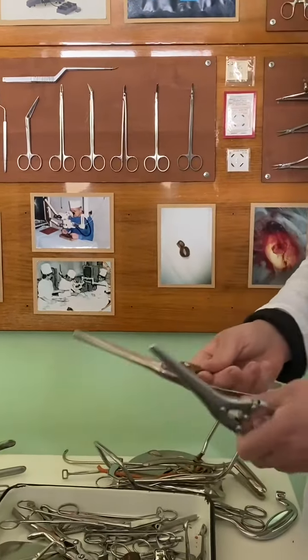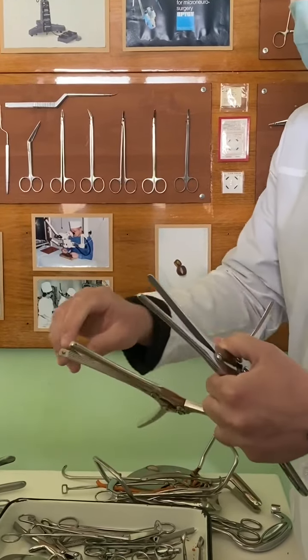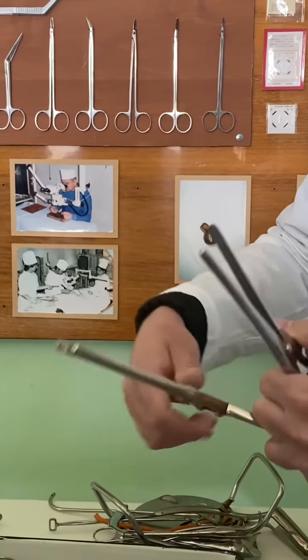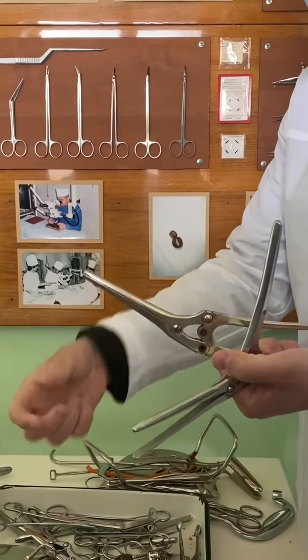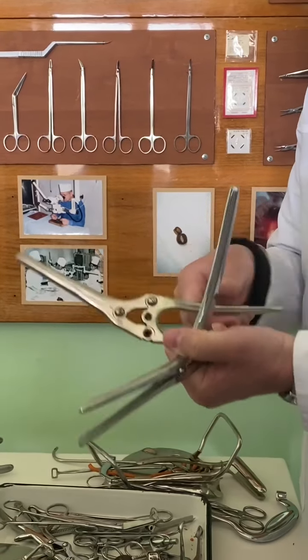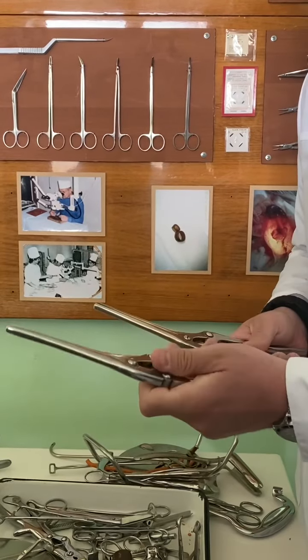Two types of Payr's clamp. Payr's clamp is named after the surgeon Payr. This one is intestinal, this one for the stomach. The difference is this sharp element. This is a single tooth. If it's present, it's necessary for the stomach, for clamping of the stomach's wall, and it passes through and makes a perforation. And of course it's more traumatic. That's why the part of the intestine or stomach which we clamp with this instrument we must cut and remove. This one is free from sharp elements. They are just hard clamping of the intestinal lumen.